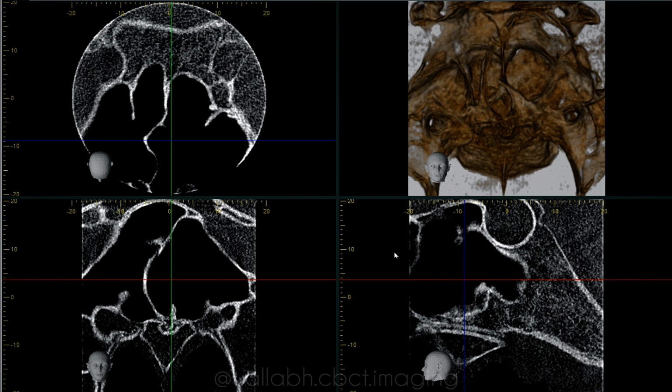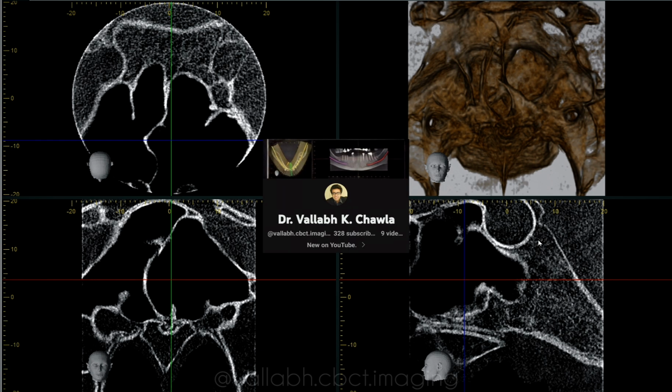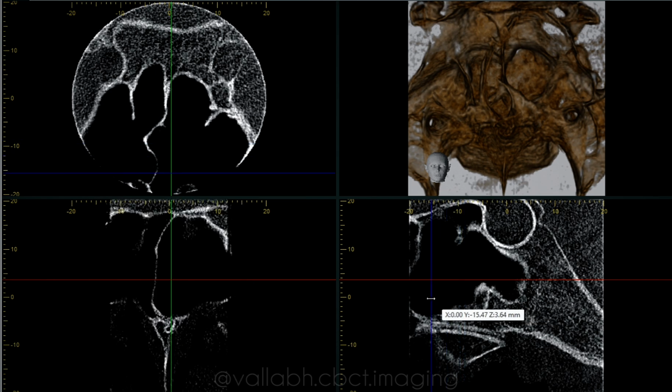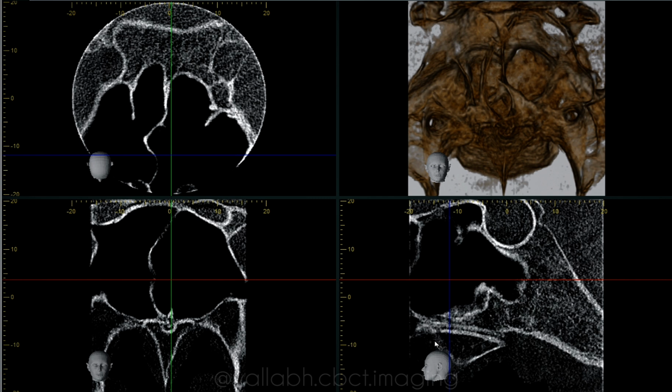Okay, so it is basically a midline structure that is located anterior to the clivus. This is the clivus. So sphenoid bone is located anterior to the clivus and posterior to superior meatus of the nose. So here somewhere in this region is the nasal region, and this is the sphenoid sinus. Because it's a 4 by 4 FOV, that is a small FOV scan, the nasal structure is cut, but it is located posterior to the superior meatus of the nasal cavity. So somewhere in this region is the nasal cavity.